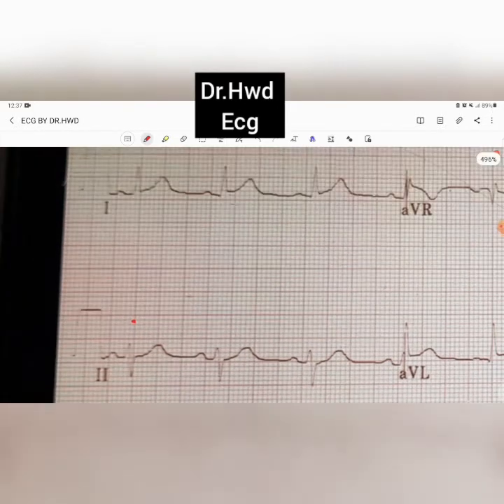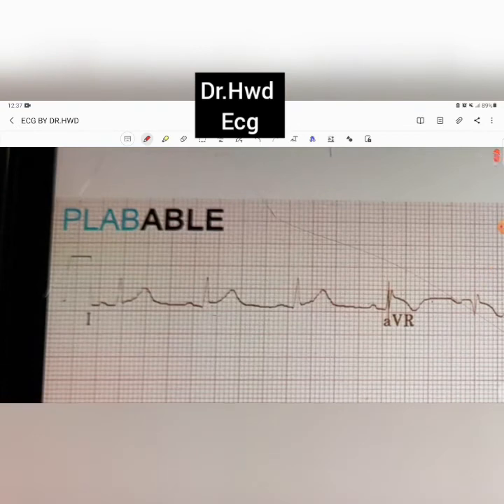Now let's look at the QRS complex in lead 1. So again, I'll be doing this with each lead and telling you the steps. The first thing is to look at the rate. I know it's repetitive, but it is important that you learn, right? So even if it's repetitive, it's better that you learn. You've looked at the ECG, you're looking at one lead. What are you looking at? You're looking at the rate. Calculate the rate. The rate seems fine. Whether it's regular, yes, it's very regular. There is no difference in there.